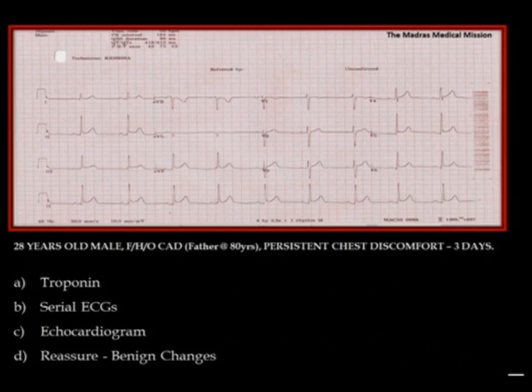of chest pain. So I believe this slide is telling you the importance of taking the clinical history very well and what actually you mean by the family history and the duration of the chest pain, in case you're looking at chest pain as a clue for a coronary artery disease. And hence this ECG should reassure. This would mean something else also. This is early repolarization, I agree. It looks like that. Yeah.